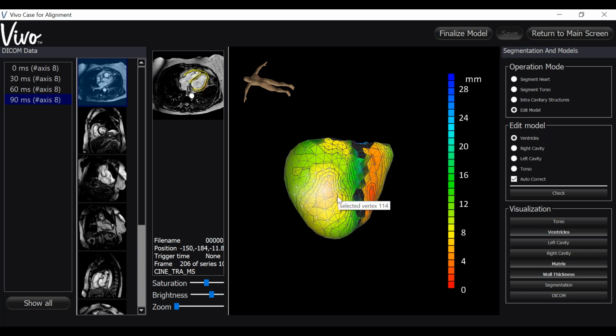And I'm going to then press Shift and scroll wheel up. It's still orangish, so I'm going to keep holding the Shift button and scroll wheel up a couple more clicks. Scroll wheel up a little more.